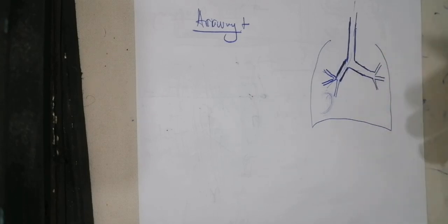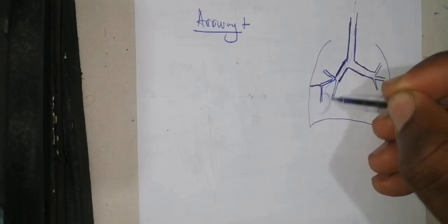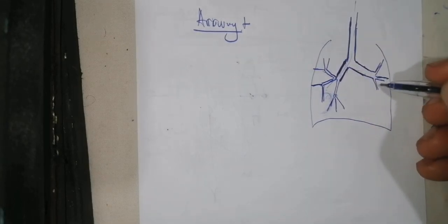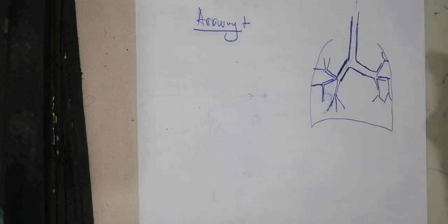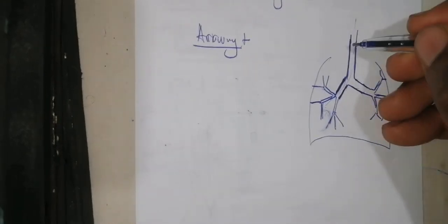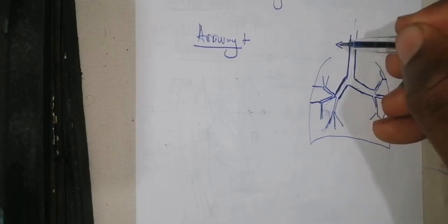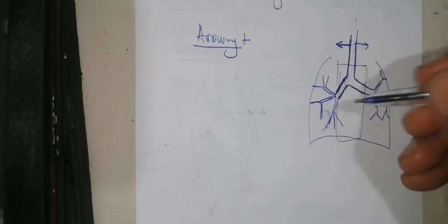Now, after the secondary bronchi, you're going to have the bronchioles, which are very thin lines. Are you getting it? Those thin dark lines, you need to visualize very well on the X-ray to know the pattern of the airways. Is it clear? Now, among the disorders, you can have deviation of the trachea, and usually deviation of the trachea is actually deviation of the mediastinum.